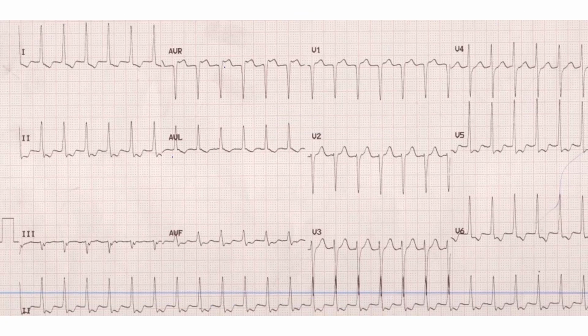There is a simpler and quicker way of calculating the approximate heart rate. You take the number of large squares between two R waves. There are two large squares. Divide 300 by that. You get approximate heart rate as 150. This is a method we usually adopt when you see an ECG to get an idea of the approximate heart rate.